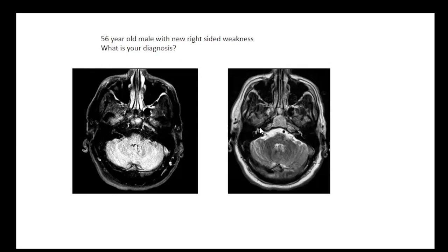Only in a normal patient, there's no signal there because of the property of high velocity flow that we get, intravoxel dephasing. That's why on the T2 weighted scan, the basilar artery looks black. So on this side, this is the internal carotid artery. It looks just like bone, but the main thing is you don't see anything. But this worm, see this thing that sits here, it's very asymmetric with the other side. This is the petrous portion of the internal carotid artery. And the fact that you can see it tells you it's abnormal.